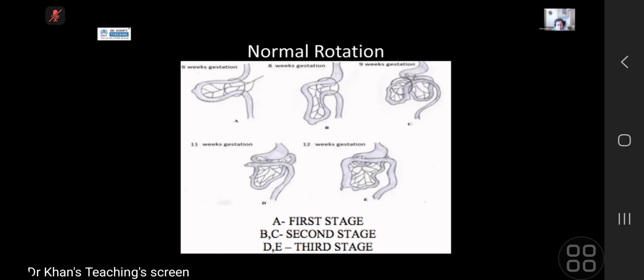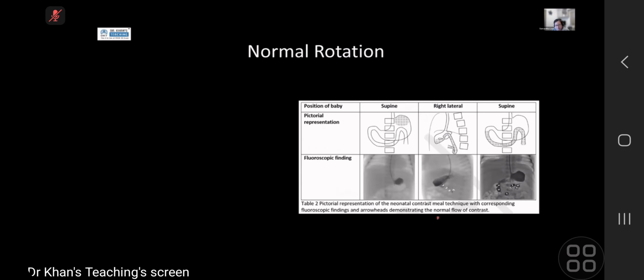Okay, where is it? So malrotation: essentially on the lateral view, what you see here is that your second and third part should go retroperitoneally, towards the spine, and then go up and anteriorly because your DJ flexure is anterior. If I'm not wrong, this is one that was described in a paper by Alan Daneman from Toronto. Okay.